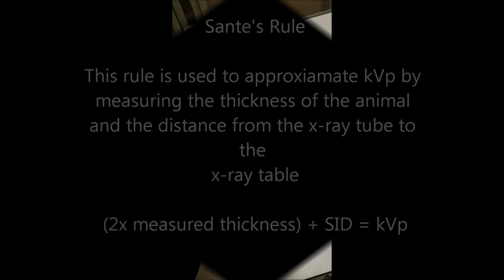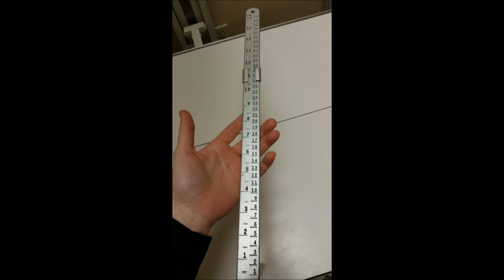And this is a caliper. This is what you use to measure your patient. Inches are on the left and centimeters are on the right. And you can see a little slider scale near the top that you can use.